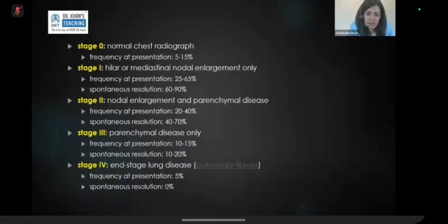You don't really see calcification in the acute presentation. It takes time to develop. The enlargement comes first, and the healing stage and the chronic stage see that lymph node calcification. If you have calcified lymph nodes and they're slightly enlarged, you're more reassured that it's a benign pathology. But when you have non-calcified lymph nodes that are large and rounded with loss of the fatty hilum, you really have to sample them. Even if you're radiologically very sure that this is sarcoidosis, the norm is that the respiratory physician will still sample these nodes endobronchially and get a tissue diagnosis of sarcoidosis.